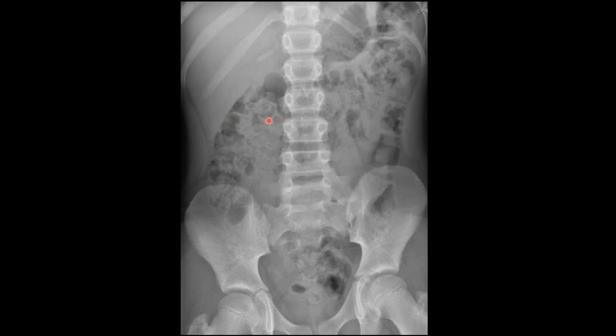Look for any stones. Unfortunately, in this patient, the kidneys are around here somewhere, but we've got a lot of gas and fecal residue obscuring them, so it can be quite difficult to distinguish any stones. I can't see any stones, so it'd be dense calcific opacities, and you follow the line of the ureter roughly coming down here. You can't see any stones there. Sometimes stones will travel into the ureter and then get lodged in the vesicoureteric junctions down here at the bottom, but you can't see anything there. Again, if that's what they're querying, they need to do a CT KUB in order to assess properly.